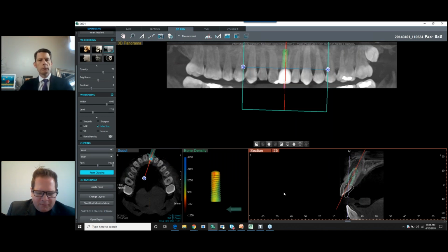So you see it's displayed in colors. What it's doing is measuring around that implant site right there as we rotate around it, and it's in Hounsfield units, which is on the left, and that's the color scale. So what that little green arrow thing that's floating there is referring to is the arrow next door there to the scout. So it's basically showing you the direction. You can see that arrow is facing the facial side right now, as you move it around. The scale there, again, is Hounsfield units, where 0 is distilled water, -1,000 is air.